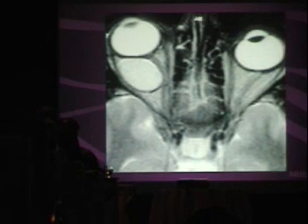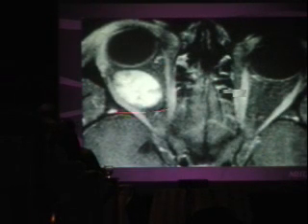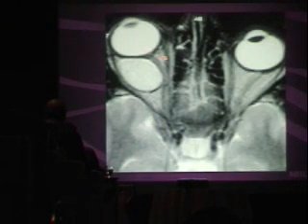The most common intraorbital mass in an adult is an orbital cavernous hemangioma. Okay, it enhances, it has all those vascular sinusoids. It's a true tumor, you can scoop it out. But you can also get intraorbital schwannomas that can easily also displace the optic nerve like that.